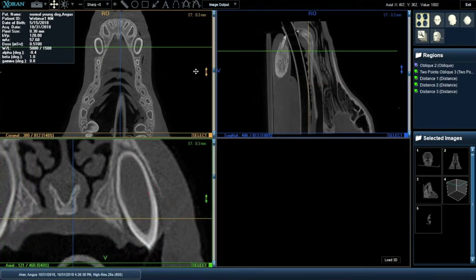It's a little different. This tooth is still erupting and forming. This buccal bone is very thin. In fact, it is so thin and so delicate that the crest of bone becomes a little bit difficult to see. But that is also normal anatomy on this young patient.